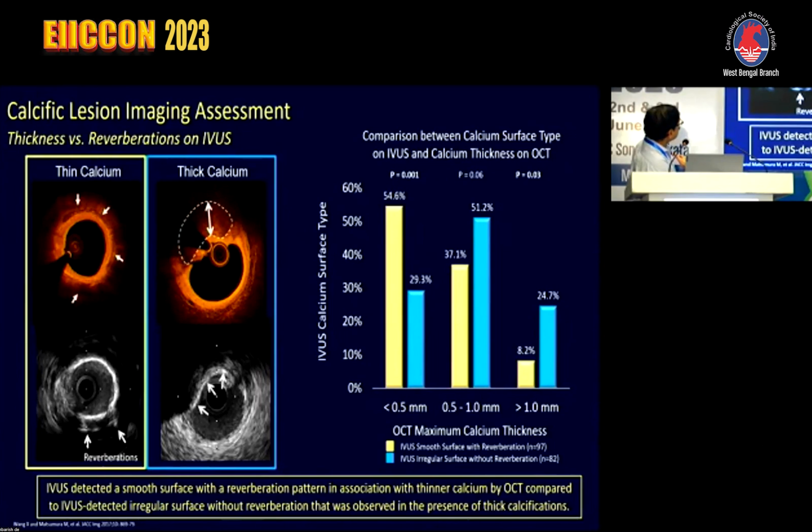This, on the other hand, is less likely to be modified by balloon dilatation. What will happen is if you inflate your balloon, it will expand in this direction. You will get a stent expansion in this case, but it will be sort of an eccentric expansion.